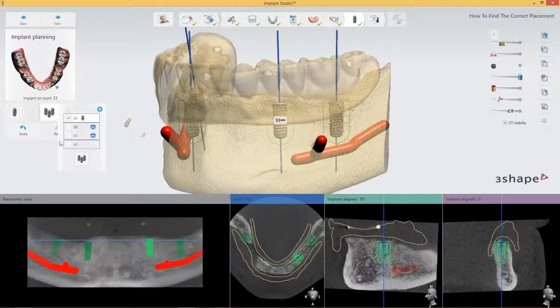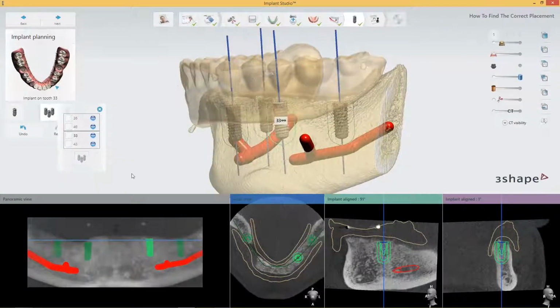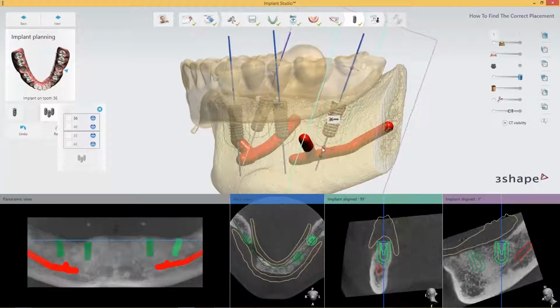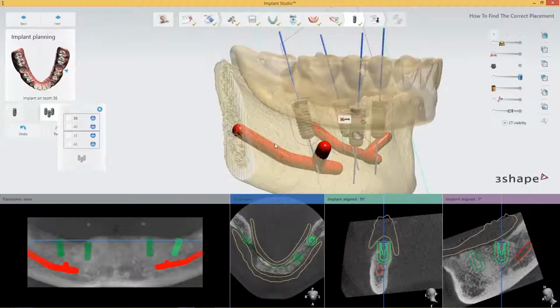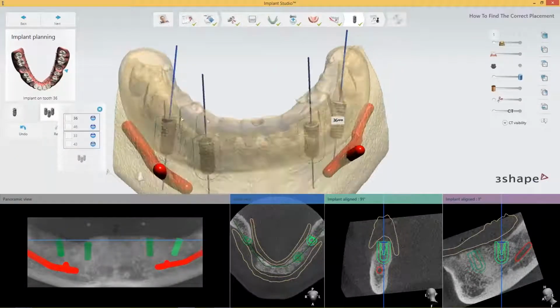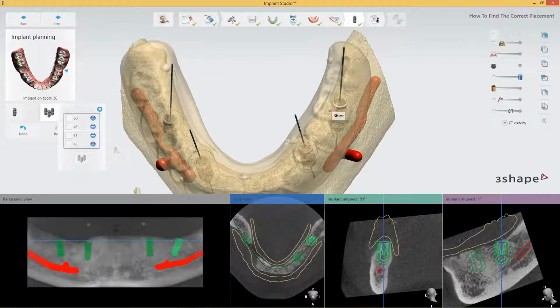Often for the distal implants in all-on-4s, we know we often work with some kind of angulation. So here grouping just these two is not necessarily that it will create the right grouping or the right parallelism because we need to make sure that they also follow the arch shape and whatnot, right?